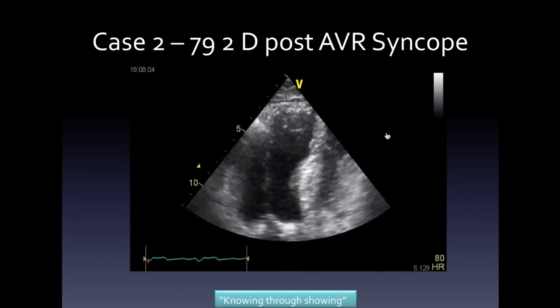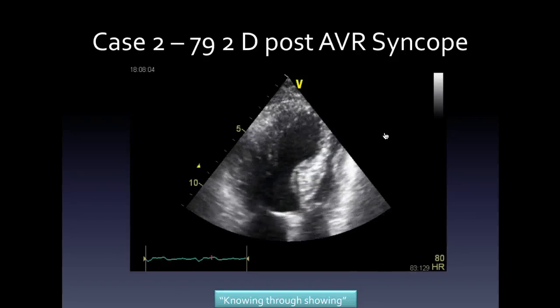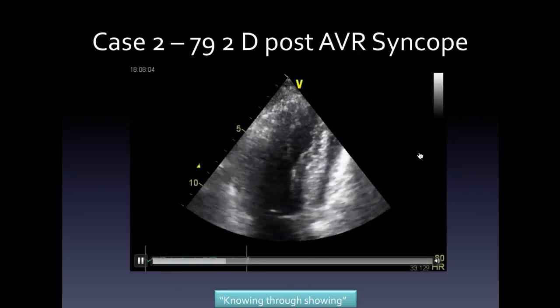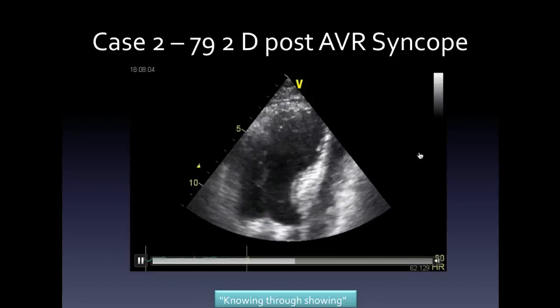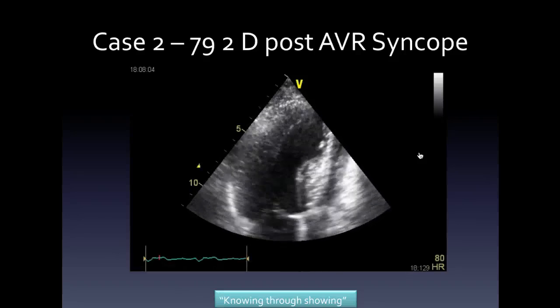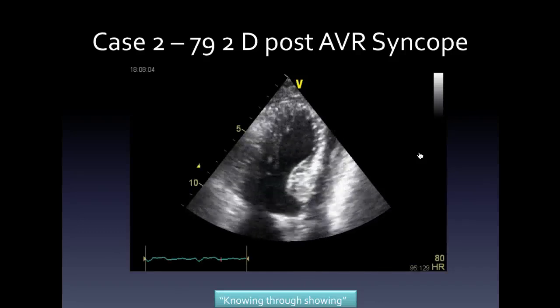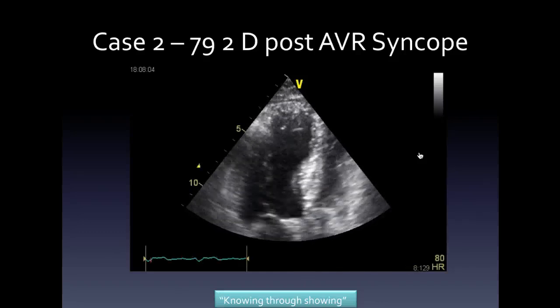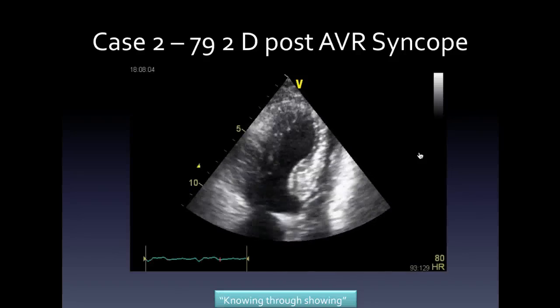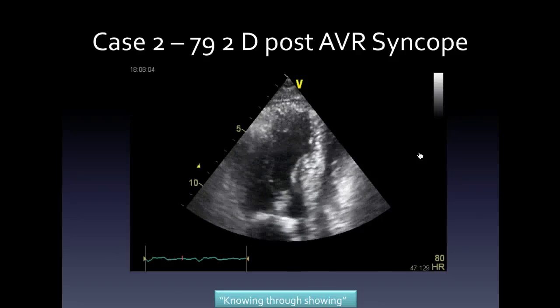He also, as you correctly said, has an interventricular conduction delay, and you get a hint of it on his ECG. See his ECG down there? It shows a wide QRS. So he's got distal septal dyssynergy, okay? You can't tell just from the ECG, because we don't know what lead it is, whether that's left bundle branch block or right bundle branch block, or non-specific interventricular conduction delay. Or, if he's post-surgery, he still might have his pacing wires in, so it could be paced rhythm. All you can say is that he's got a dyssynergy. That's all you can really say.